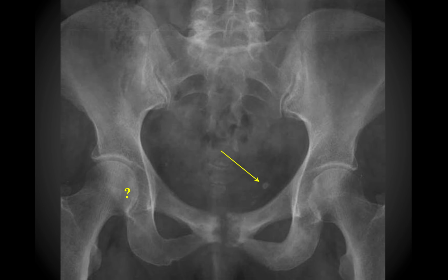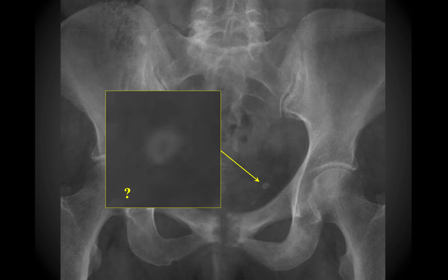And here we see in this patient, there's also an example of a hyperintensity down here. I want you to think for a moment about whether you think this would be a ureteral stone or something else. If you look at it closely, this is a zoomed in view of it, you'll hopefully note that the center part of it is hypointense. That indicates that this is not a kidney stone, not a ureteral calculus, but instead it's a phlebolith in this case.